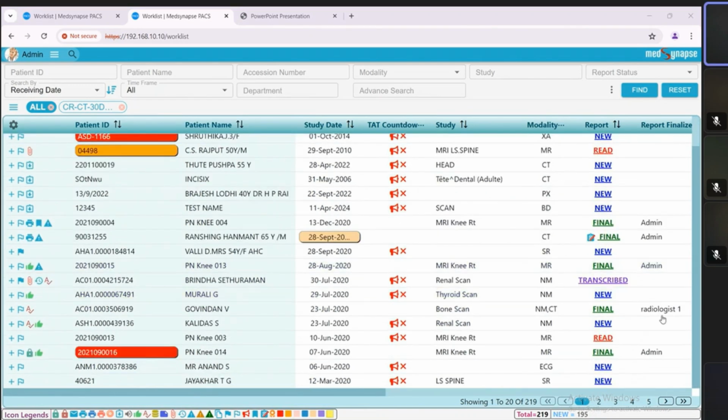So what I'll do is basically explain the icon legends at the bottom, and then we can move on with the image viewer. And if you want to know a specific feature or function, I'll explain that explicitly. So starting from my left, these are two locks.